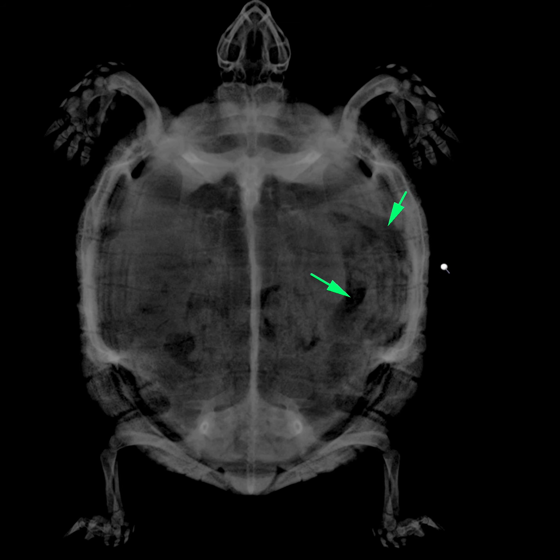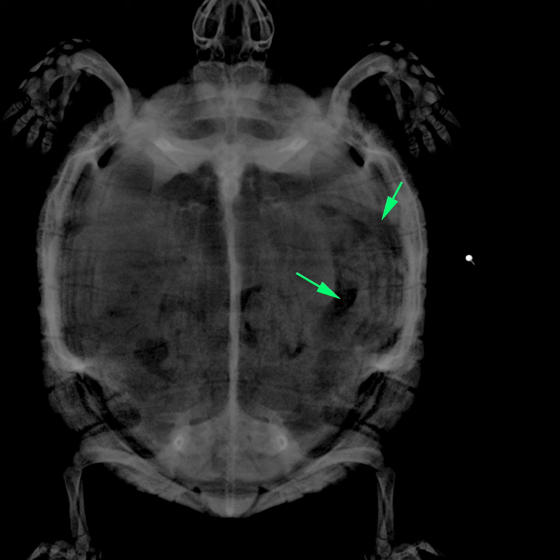Now, the presence of gas allows a better delineation of the content of an organ. So in this case, in the lumen of the stomach, we have this well-delineated, smoothly margined, soft tissue, slightly heterogeneous structure here. This reflects the content of the stomach.